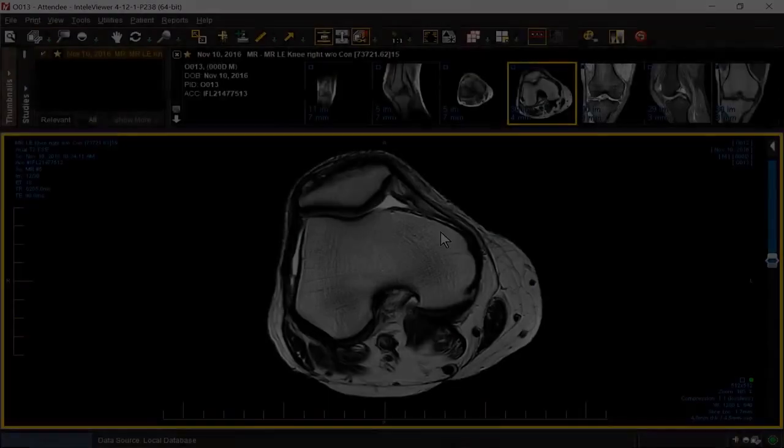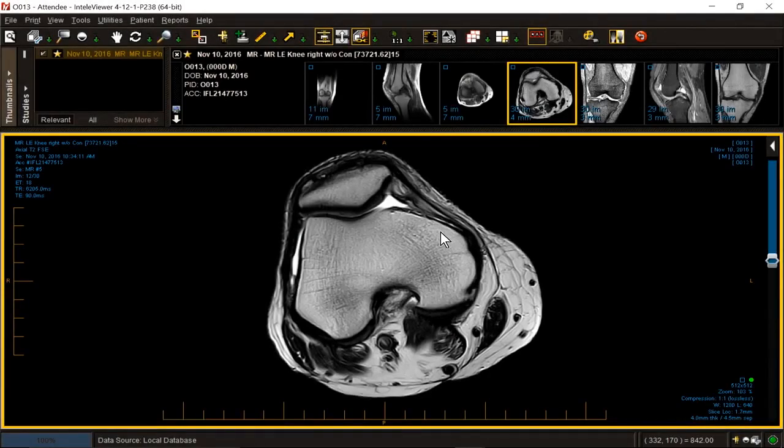Next. Posterior pain with deep flexion and rotation. Evaluate for posterior horn meniscus tear, Baker cyst, posterior capsular sprain, or other. In other words, rule out life itself. Please solve this problem for me. The patient complains of pain and stiffness since 9/16, so it's been about 2 months.